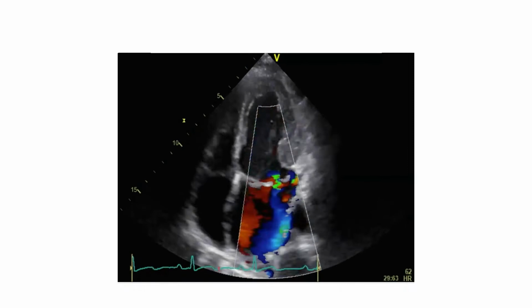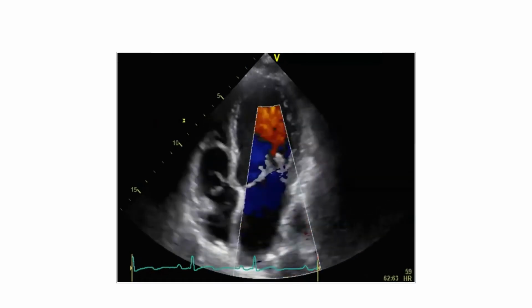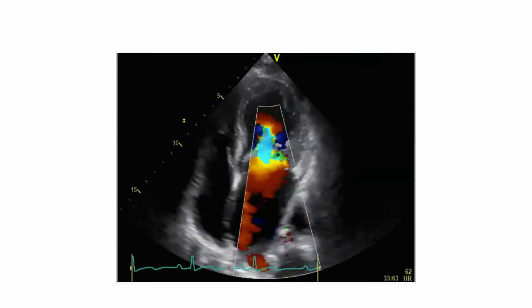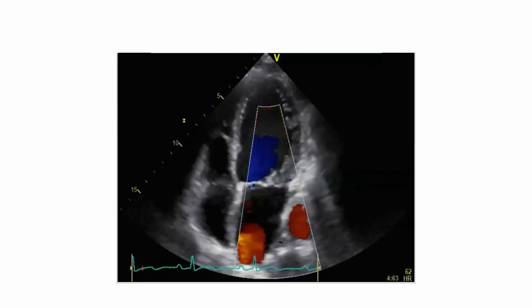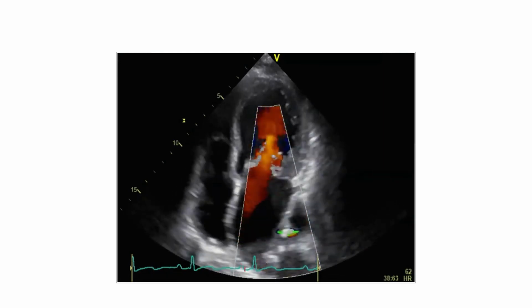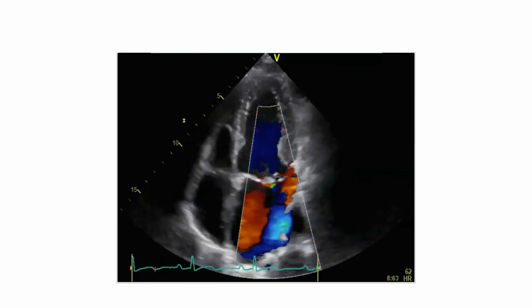But we have other forms of mitral regurgitation as well. What do you think about this mitral regurgitation? Yeah, here we have actually a really nice and crystal clear prolapse of both leaflets. But actually, when we look at color Doppler, we get a little bit disappointed somehow because I would expect more. Mitral regurgitation here is only mild, I would say. Which only shows to prove that the degree of morphologic abnormalities does not always relate to the severity of MR. This is a beautiful example where MR is relatively little, even though we have massive thickening of the mitral valve.